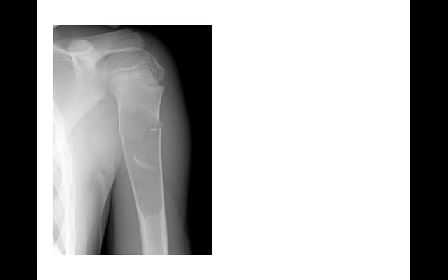All right, next case, a frontal radiograph of the humerus. We see this is a child. Physes are still open. So how to describe this lesion? We have a geographic lytic lesion, narrow zone of transition, non-sclerotic border, which is centered in the proximal metadiaphysis of the humerus. There's a pathological fracture. There's this crescent of bone floating in the lesion, which is a fallen fragment sign.